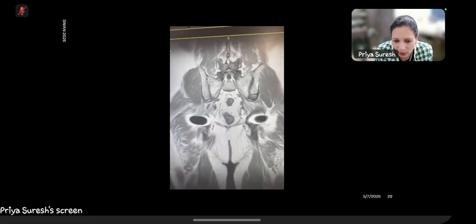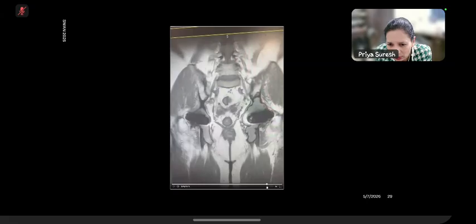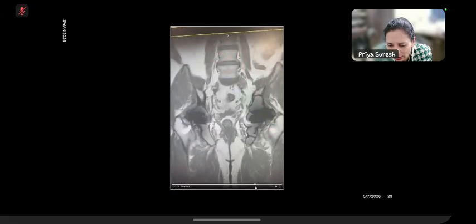Yeah. So just try and go back and just pause it there. So you've seen this on this thing, but I just want you to appreciate, can you see the ischium? Yeah. No, the whole thing is replaced. It's all expanded, and this is very extensive osteolysis. And if I go back, the MR was not done like years after the plain film.